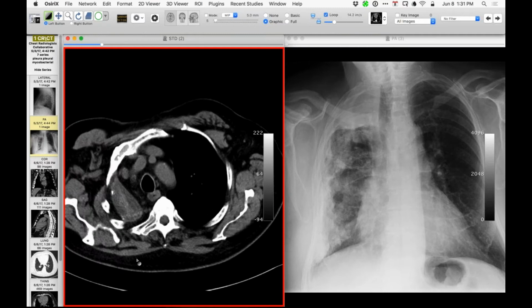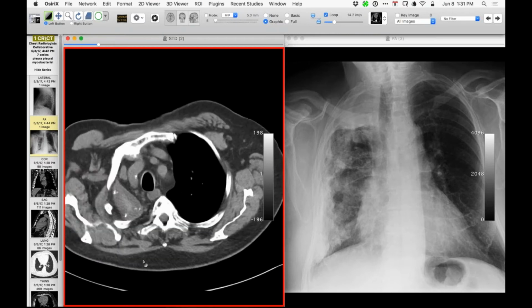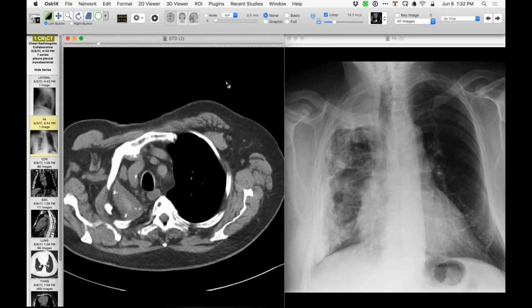They would peel the parietal pleura away from the inner chest wall, create a pocket, and then fill that with something, including ping pong balls. The lucite plombage was another thing. So this is probably maybe some scarring after that process. But the oleothorax component, if it were still there after all these years, should have low attenuation.